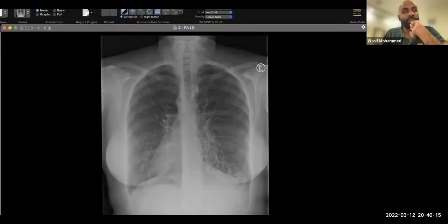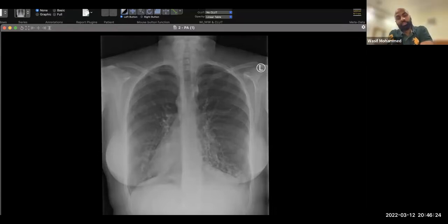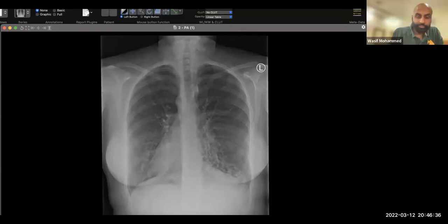So just bronchiectasis, you would put in cystic fibrosis. But since there is dextrocardia, it's more in keeping with Kartagener syndrome, right? But for any bronchiectasis, you can put in cystic fibrosis. They're more likely to involve the upper lobes, and they'll have a similar picture to this. Okay.